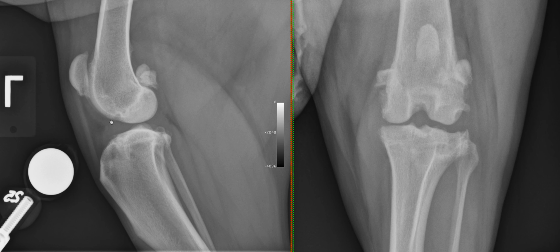So you can see all this soft tissue opacity pushing the fat pad. Normally the fat pad would extend a bit further caudally into the joint, on the surface of the joint there.